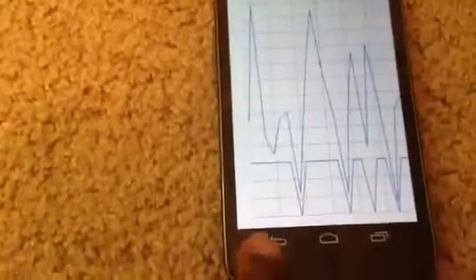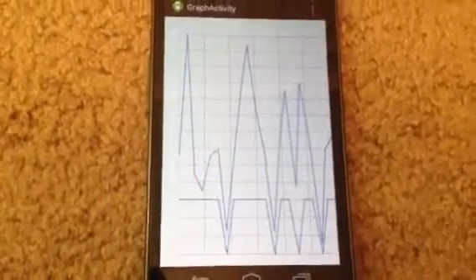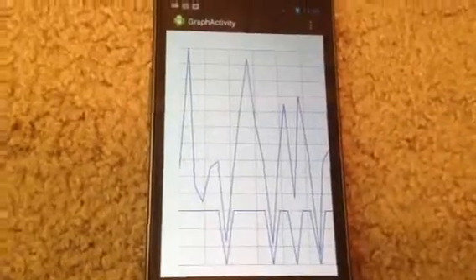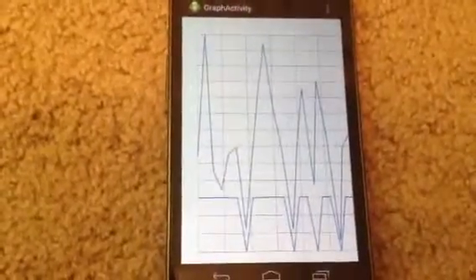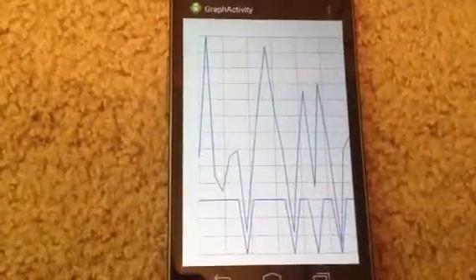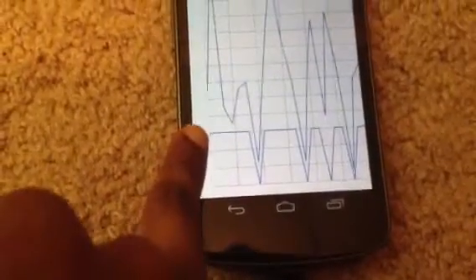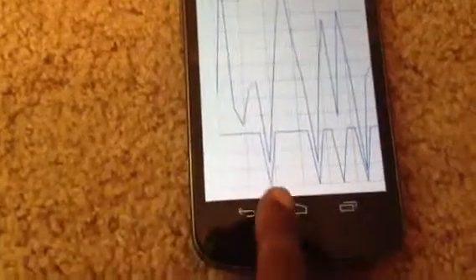And if you see here, we have scaled up the insulin levels. So according to an online survey, we found out that a single unit of insulin is capable of reducing around 50 mg per dl of blood glucose. So when the user enters something like one unit of insulin, then we display it as 50 here. So as we can see, this means that the user has taken 2 units of insulin at these points, and he has taken only 1 unit of insulin at this point. So this is 50 and this is like 260, 255.